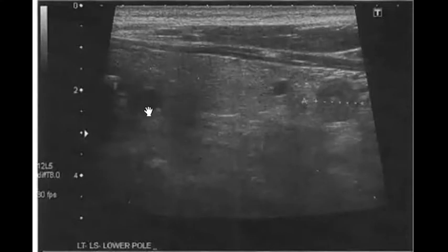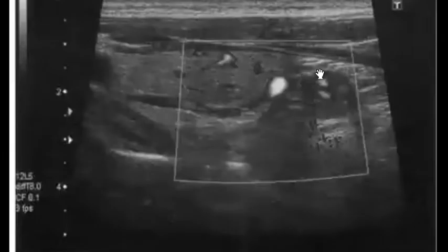Okay, perfect. And these nodules, hypoechoic lesions, the largest one in the left lobe. And maybe if you open color Doppler, you can see that there is something going through these lesions. So it is vascular, hypervascular. So a hypoechoic solid nodule in the inferior portion of the thyroid lobe. Nice. And Nermeen, perfect. Lower lobe, yes. We have a lot of expert radiologists in sonography, yeah, nice. And on Doppler, it is hypervascular.